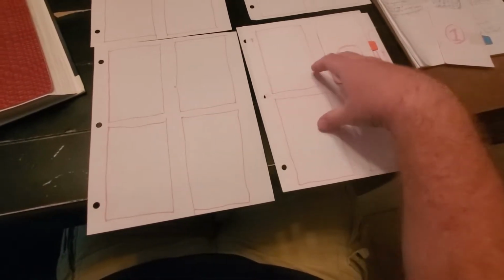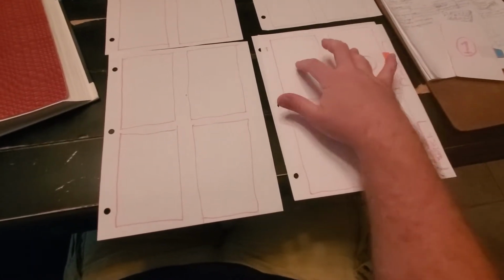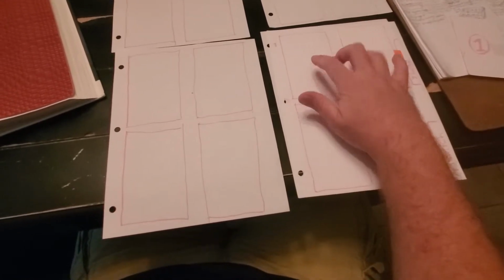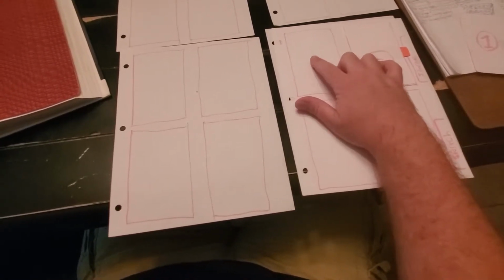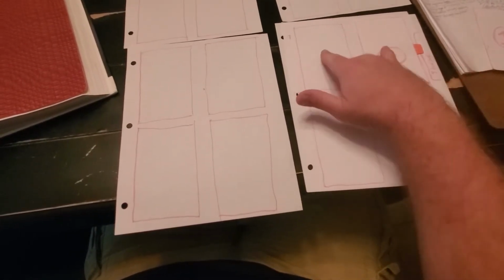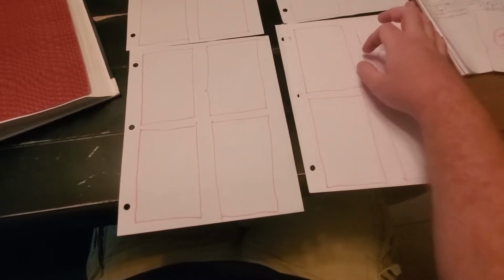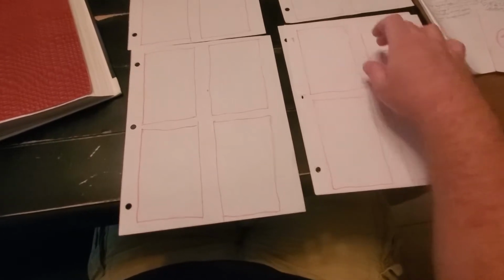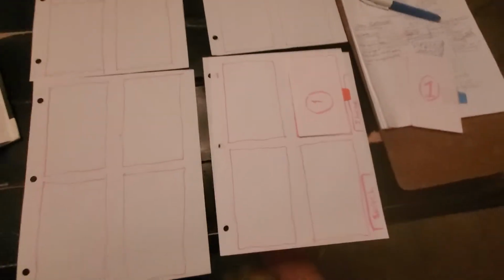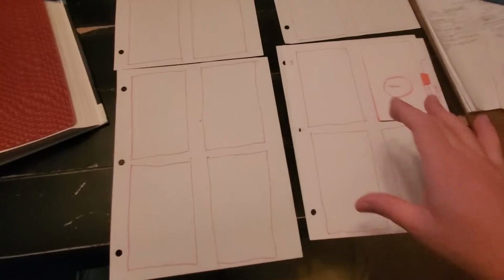So there's 4 here, and each pixel is measured by the pixel pitch. It also has to do with it. It's measured from the center of one pixel to the center of the other pixel. These ones are kind of bad because it's pretty far apart. You've got a large section here that's not really doing anything. So pixel pitch is also going to affect your spatial resolution, and that'll come into the matrix later.